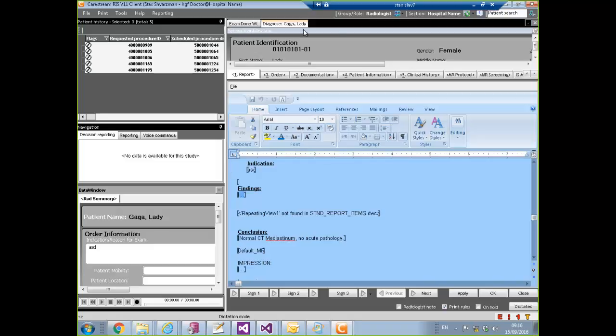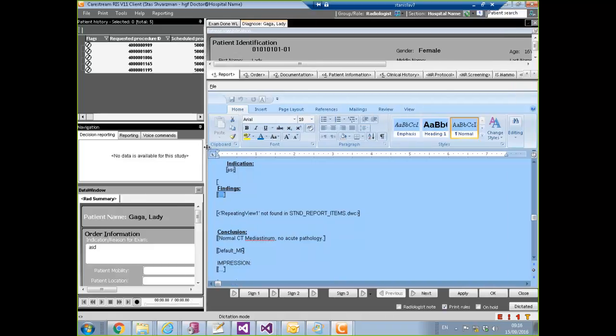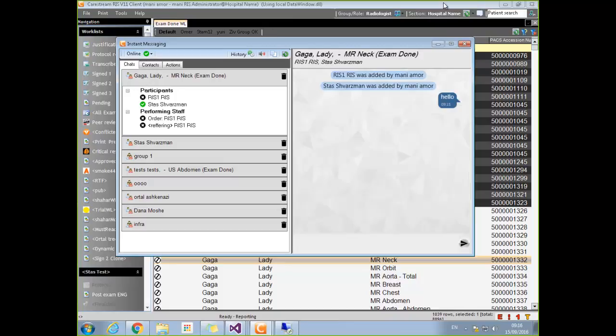And now I actually have this diagnosis about this test. So, okay, this is all the three tabs. Now here I have a toolbar that on the first one I can refresh. Okay, I start from here.